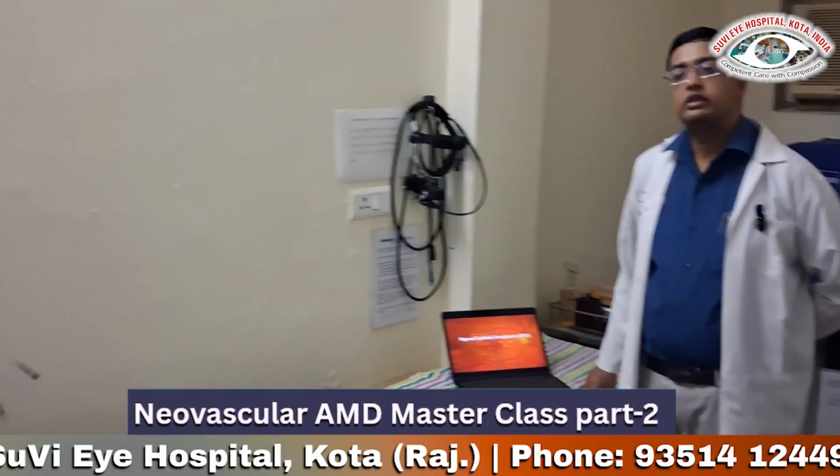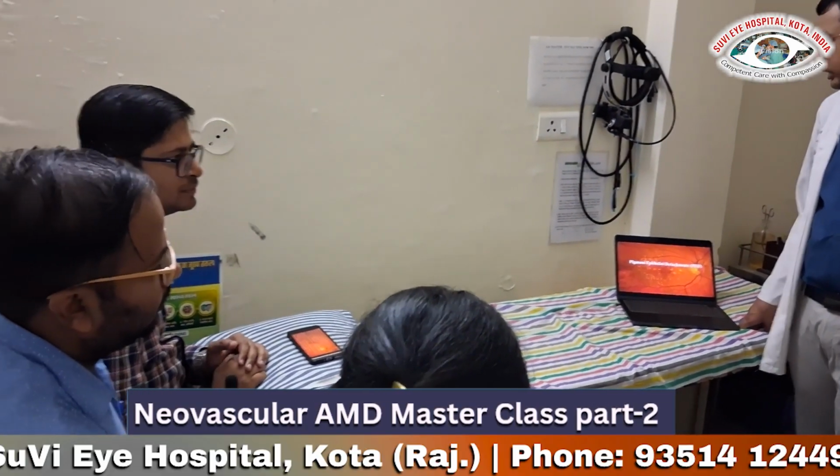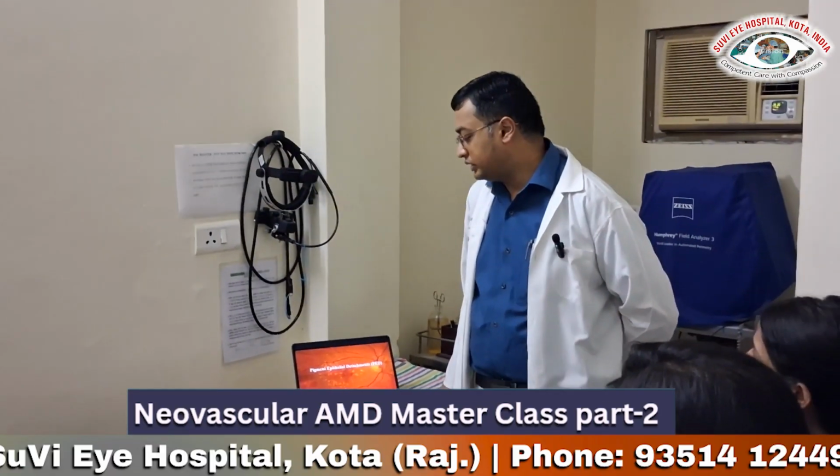Polypoidal choroidal vasculopathy. Yes. So why is it important to differentiate polypoidal choroidal vasculopathy? Is that okay, there is a fluid there? The patient comes to me as a retina consultant, there is a fluid there, the treatment is anti-VEGF only. So why is it important to differentiate PCV, whether or not you have an FFA or ICG, from the other types of CNV or neovascular AMD?